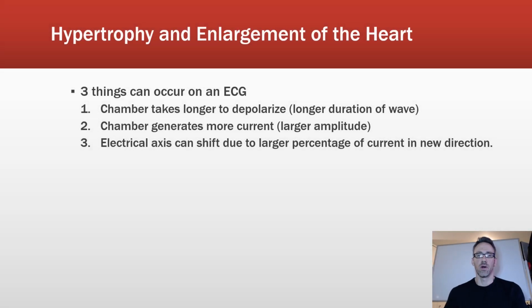In this video, I'll be talking about how to calculate an axis on the ECG, and then, of course, how we interpret that in the context of our patient. To begin, when we calculate an axis, we're really assessing hypertrophy or enlargement of the heart.